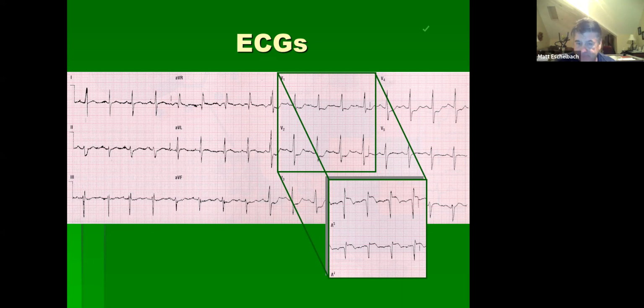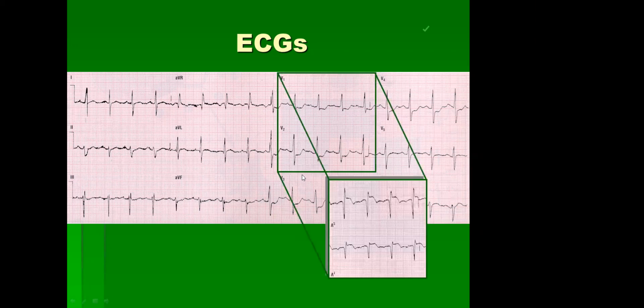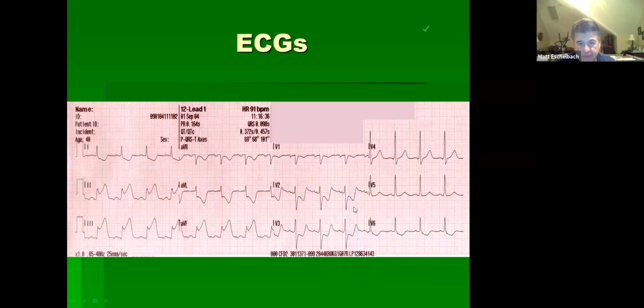All right. There's my ST depression, which is pretty profound. So I take it, hold it up to the light, flip it, and I've got an acute ST elevation. So this is a posterior MI. All right. Last one.